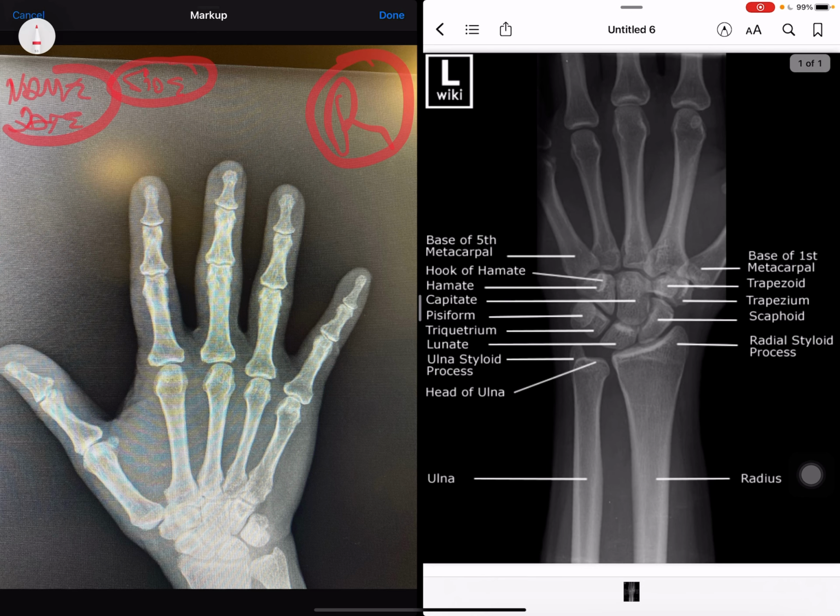So anyway, if you follow the bones here, we don't call these fingers with numbers, which a lot of medical people do, which is wrong. In hand surgery, we call this a thumb, and we call this index, middle, ring, and little. Don't ever do that digit stuff. Call it the thumb, index, middle, ring, little, because everybody has confusion. Some people call the thumb number one, and some call this one, and then 2, 3, 4, so it's confusing. Just use standard measures. You never go wrong. In medicine, you just want to keep with the old tradition.